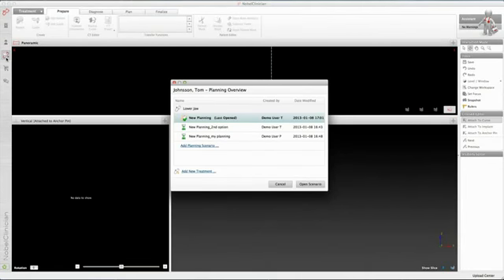The Planning Overview window appears. If a new planning scenario needs to be created, press Add Planning Scenario. For example, you are treating an edentulous patient, and you have made an all-on-4 treatment plan for the upper jaw. Another planning scenario could be to plan 6 implants.